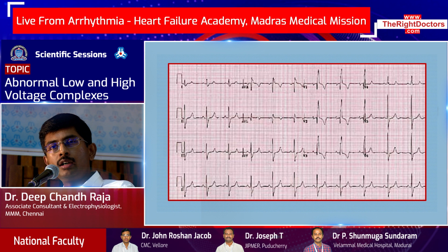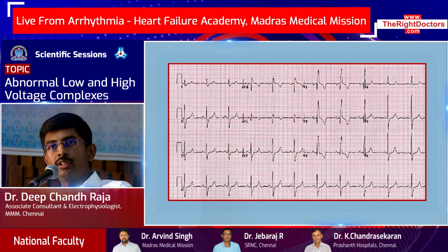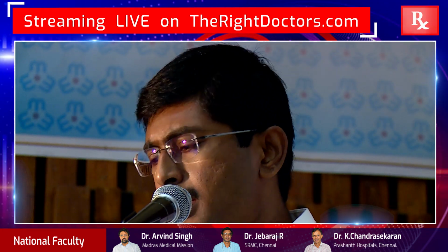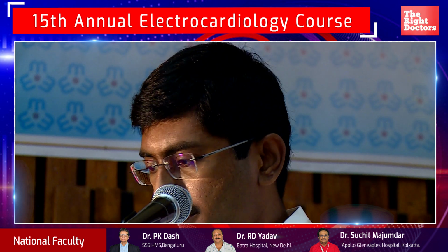And you can have T-wave inversions. What you see is T-wave inversions in the anterior chest leads. So this is almost a right ventricular hypertrophy with a strain pattern, a pressure overload type of right ventricular hypertrophy with a right axis deviation. Considering this was a young boy, this turned out to be a severe pulmonary valvular pathology, severe pulmonary valvular stenosis.